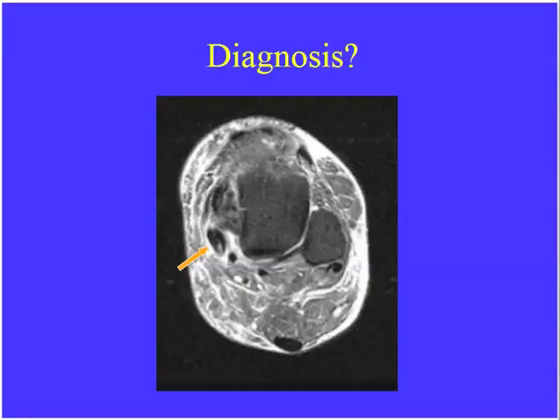Okay, what about the diagnosis here? This is a very common question. They point to one of the tendons that's abnormal, and then they ask you what the tendon is and what the abnormality is. But we see here's the fibula. Let's look at what we do know. This is the Achilles tendon posteriorly. Here's the fibula, so we know this is lateral. This is medial. And we have 3 tendons medially here, and the most medial one has signal running within it, has a split or a cleavage right through the middle of the tendon. So this is a longitudinal split through this tendon.